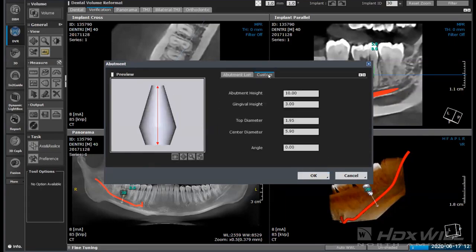and height. We also can do a custom on any of these that allows us to create a custom abutment where you can change the height, you can change the angle, so that again it gives you an approximation in your planning as to where you're going to put the abutment, how high you're going to put the abutment. I actually had a very curious question the other day about how high can we make it, because what the doctor liked to do, if they were doing a procedure like an all-on-4, was have abutments very high so that he could make sure that he could tell that his implants are parallel, to make it easier for when they finally put the final denture in, that they had parallel implants.